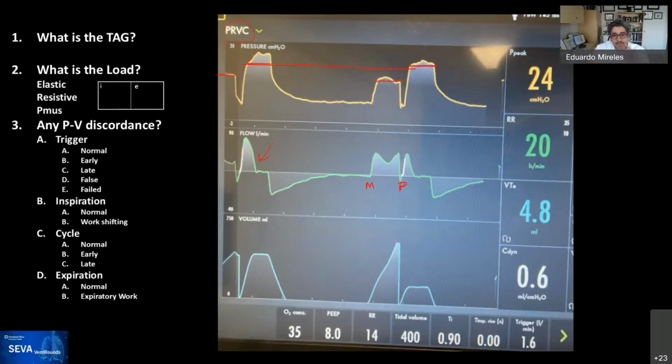The tidal volume is way above the target for this patient. And so if that was the case, it should use even less pressure for the next one, right? And it uses more. Yeah, I checked this out in the lab a few years ago, but I just forgot which it is. Come on, Rob. You have to remember everything. I have to remember every little detail.